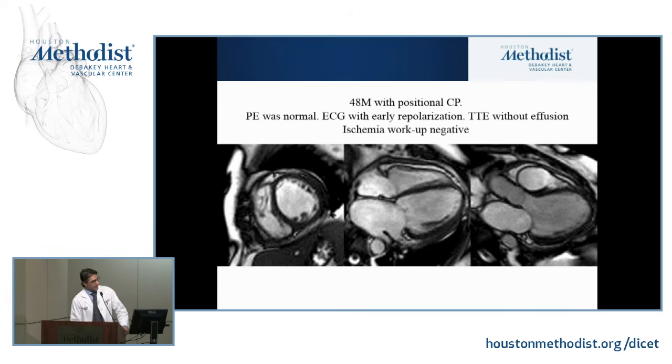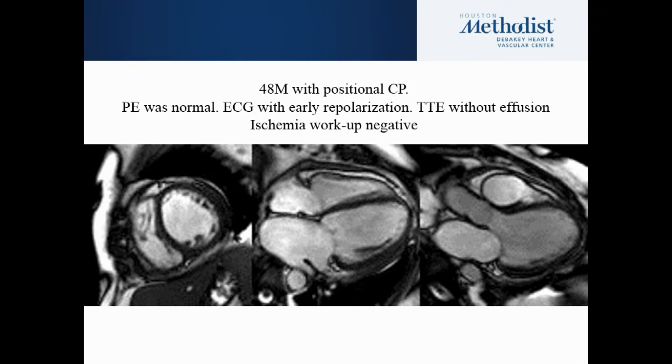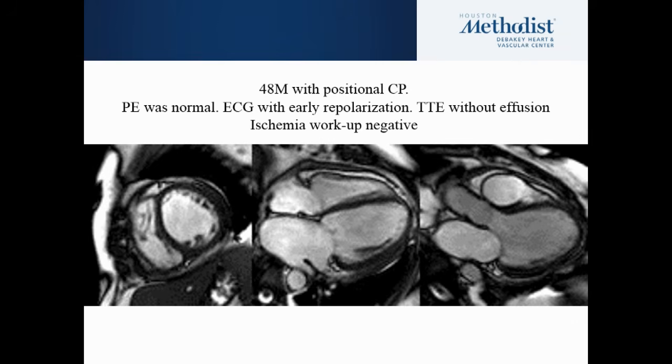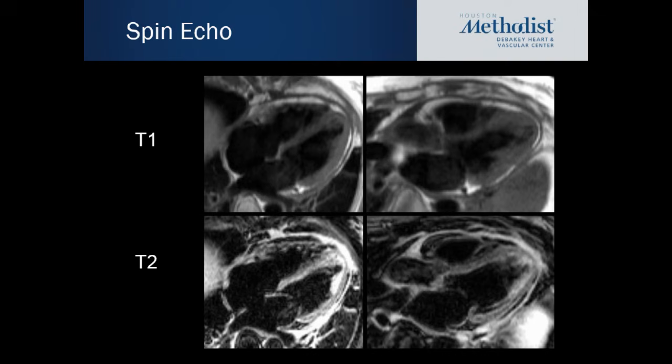If you look at this heart, I hope most of y'all will agree that, at least in these images, you see something here and anteriorly. And if you look a little bit further, you may see something here laterally, and you see it's more here anteriorly. Well, this is thickening of the pericardium. It definitely is not the typical fluid that I had shown you. But this was where Dr. Zogby was alluding to, how can we use CMR's tissue characterization to go further?